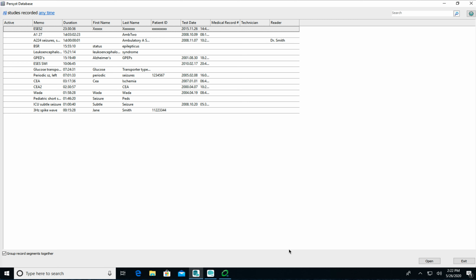Hi, this is a screencast to go over the creation of frequency maps within Persyst and a little bit of customization of those. This is Michael Guest, VP of Research and Clinical Applications for Persyst. Let's go ahead and jump right in.